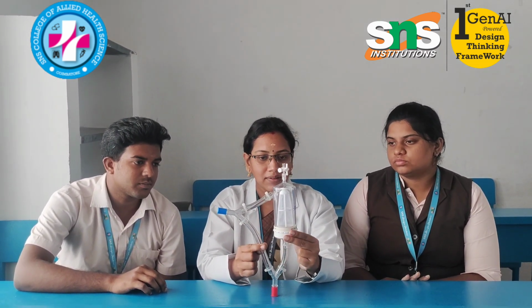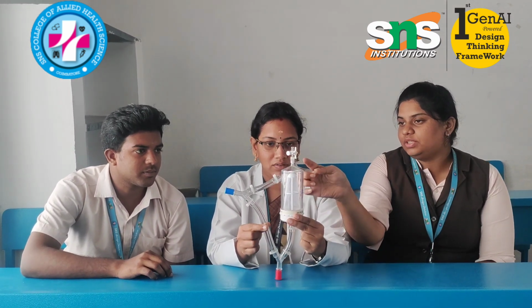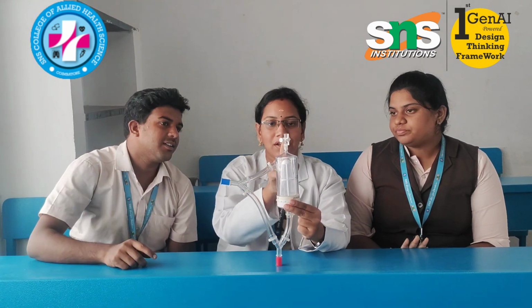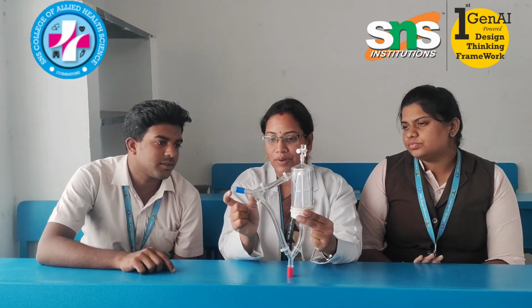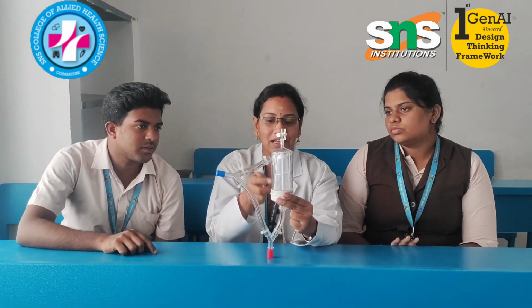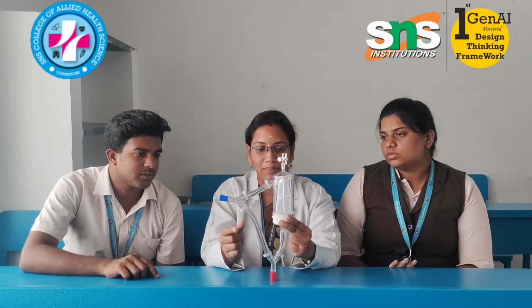Any doubts here? As the fluid comes here, the air will move out from here. This step requires only minimal flow. Why? Because if you give a high flow, there will be damage to the inlet port. So you are giving a very minimal flow.